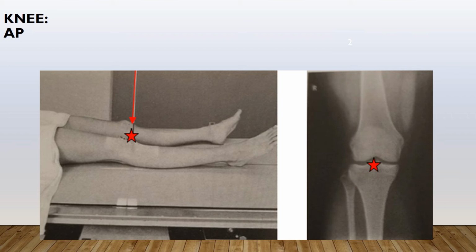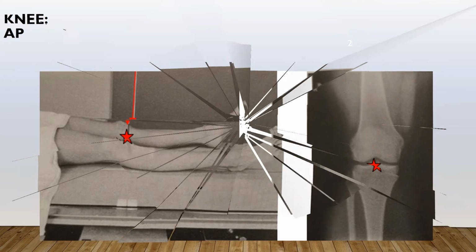When you evaluate your image, you want to open the femorotibial joint space. There should be no rotation evident by symmetric appearance of the femoral and tibial condyles. The medial half of the fibular head is superimposed by the tibia. The intercondylar eminence is seen, and the soft tissue and sharp bony margins and trabeculation are clearly demonstrated.